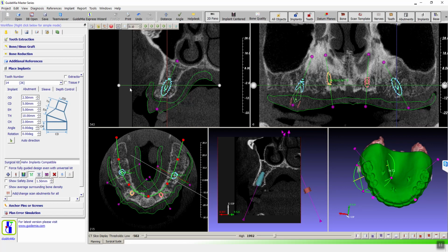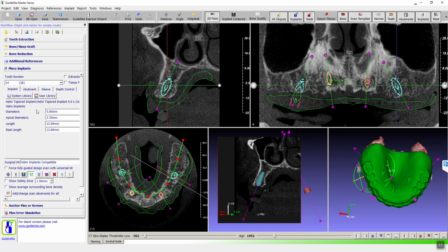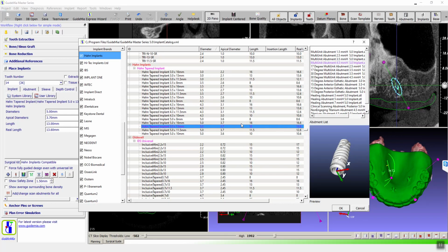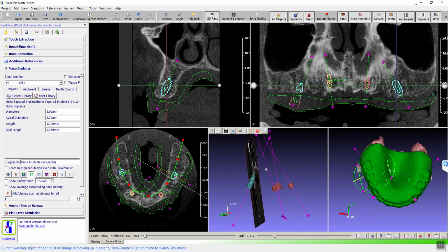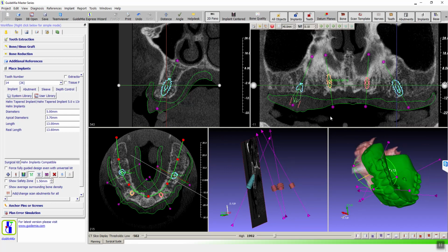But if we go back to the abutment choices, we actually are using straight abutments. We can use angular abutments. Let's say we choose 30 degrees for this one. Now we change the abutments to a 30-degree.